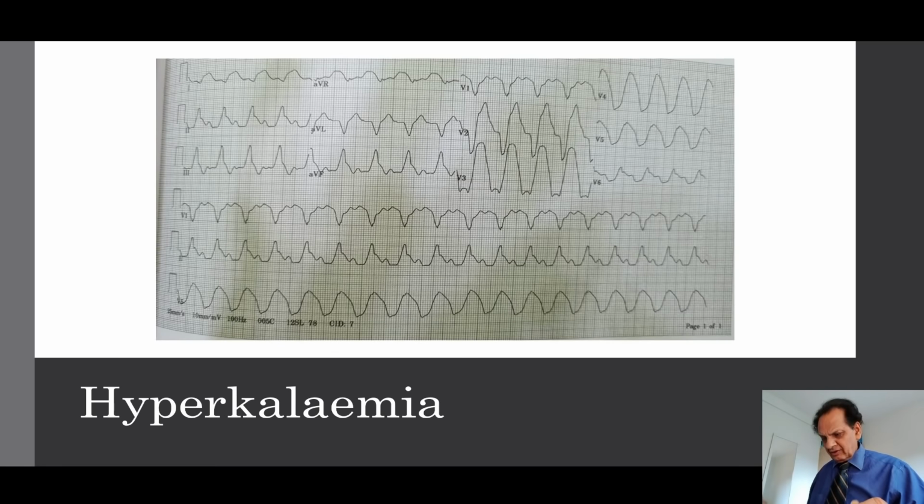I have shown you the 12 lead also. The sine wave pattern here may be confused with ventricular tachycardias and other dangerous rhythms, but to realize hyperkalemia is very important.